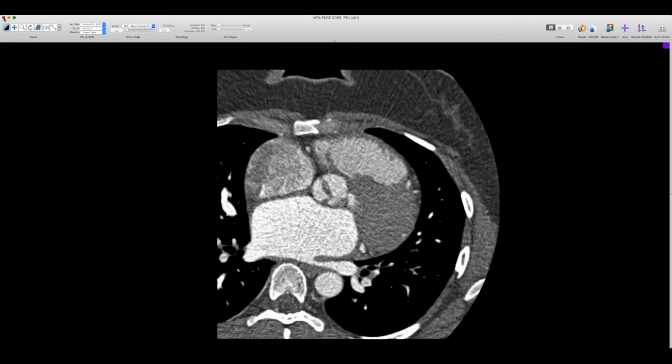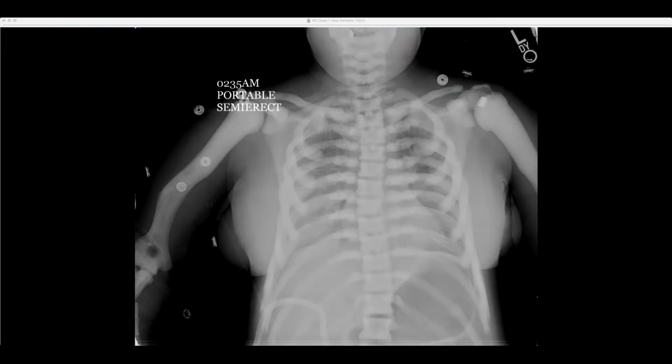That is interesting. What's the treatment for that? Do they go in and resect it? Well, yeah, presumably they're going to go in and resect this. You can see that there's a little bit of septal, some concentric, a little bit of asymmetric LVH as well, but presumably you can imagine how most of the obstruction here is going to be due to this membrane. So presumably resect the membrane and see what the flow is like then. But yeah. All right.